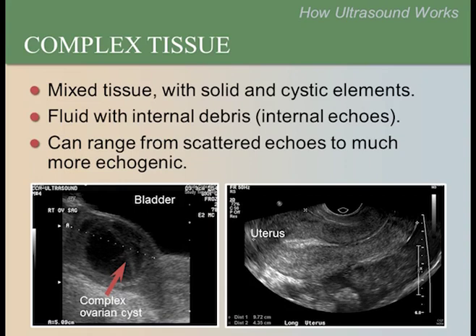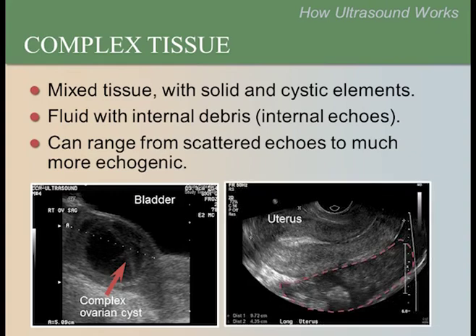The right image shows a uterus without a pregnancy. Notice that there is complex tissue behind the uterus that appears mostly gray and white, but also contains some black within it. The complex tissue collection is outlined here to make it clearer and is not normal. This is actually hemorrhage, a collection of blood clot and fluid behind the uterus from a ruptured ectopic pregnancy.